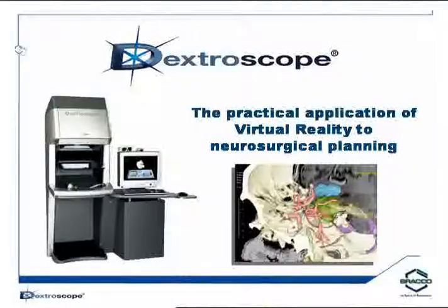But basically, it's a console like this that has a monitor, and then there's another monitor up here. And you'll see that there is a mirror here that reflects what's on the monitor. This monitor to the right is mainly a control monitor, so you do your DICOM downloading and uploading of information and your image preparation, for instance. And you actually work in this space right here.